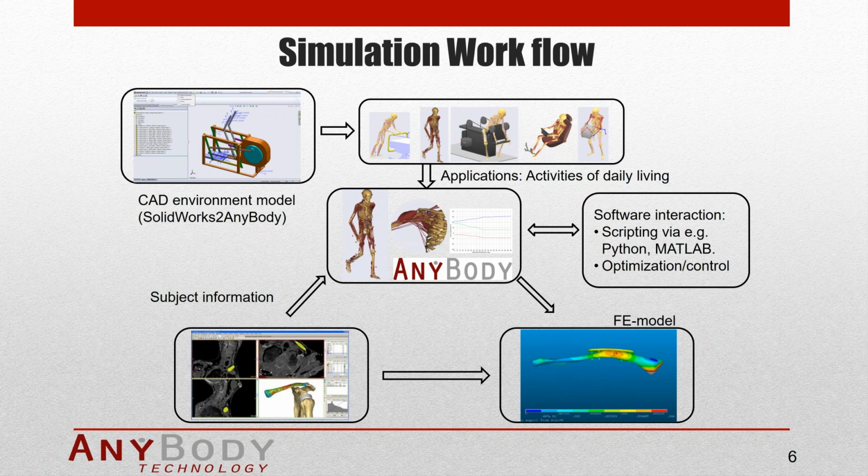AnyBody system is capable of being interfaced with finite element analysis for more local deformation or stress-strain analysis. Before, during, and after AnyBody simulations, you can use programming interface for more scripting or, for example, running control algorithms or an outer loop of optimization around AnyBody simulations.